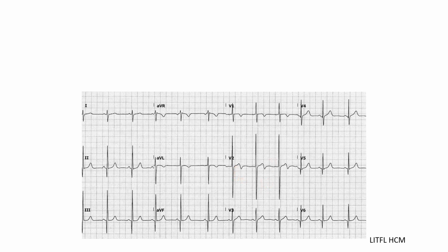And you may even have left ventricular hypertrophy, because the S wave here measures 1, 2, 3, 4, 5, 6, maybe 7, and here we're already above 7, so hypertrophy along with deep Q waves.